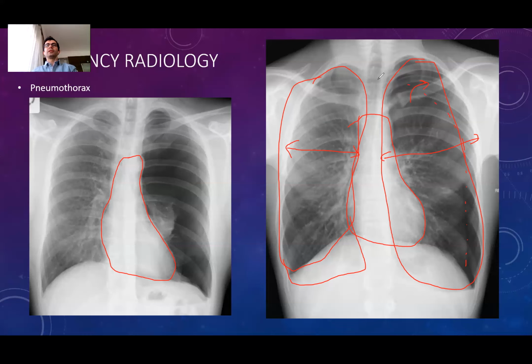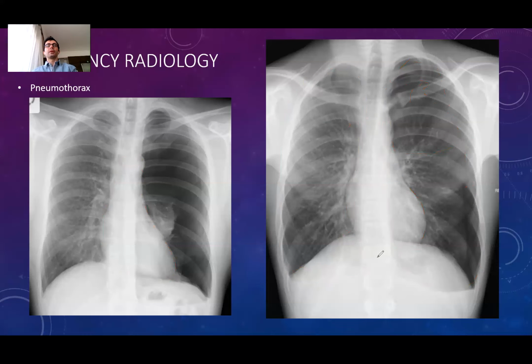So can anybody guess what I'm trying to talk about here? Is it the shifting? Because of shifting. Yeah, it's like shifting, right? It's a shifting through that. So there's a name for this. It's called tension pneumothorax. Tension pneumothorax is this one. When the air can get out to the hemithorax but cannot go anywhere else, then the hemithorax gets bigger and bigger.